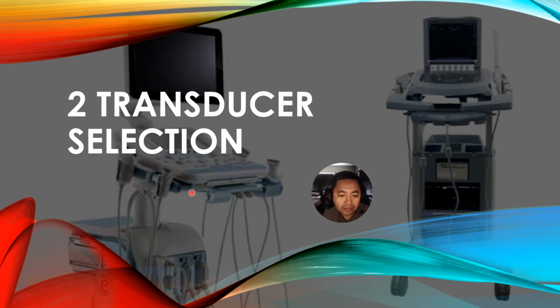As you can see in these machines, there are multiple transducer ports. Electronic probe switching is invariably present in these machines.